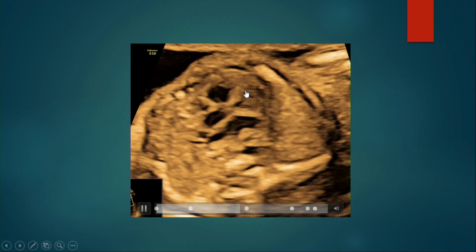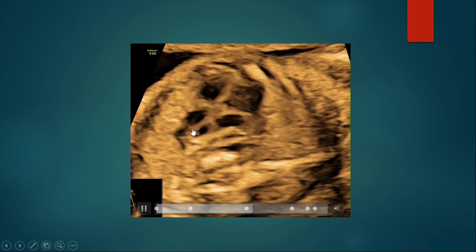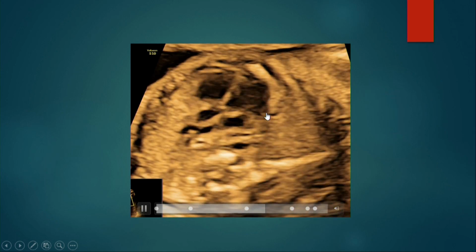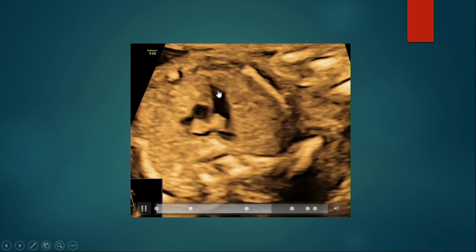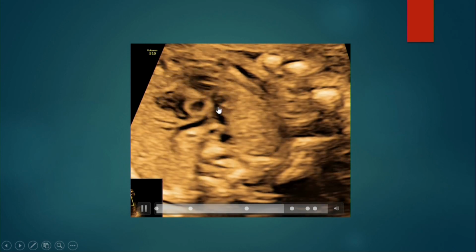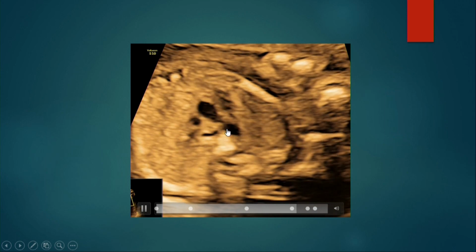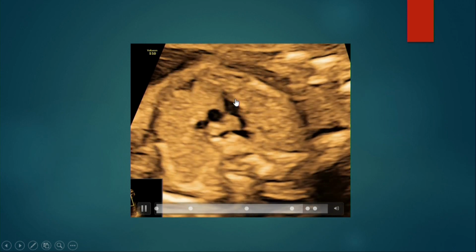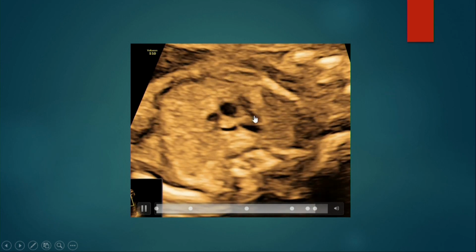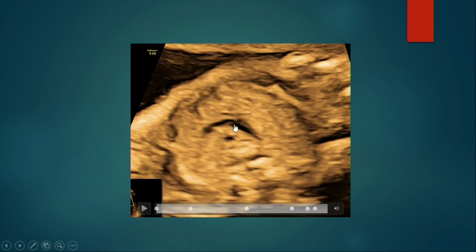the first outflow tract arising from the left ventricle, septo-aortic and aortomitral continuity. Then the second outflow tract, that is arising from the right ventricle, divides into the right and left branch. The right branch goes posterior to the aorta, the left branch continues as the ductus, joining the descending aorta. Then the three vessel view: pulmonary artery, aorta, superior vena cava, and this is the trachea at the level of the carina.